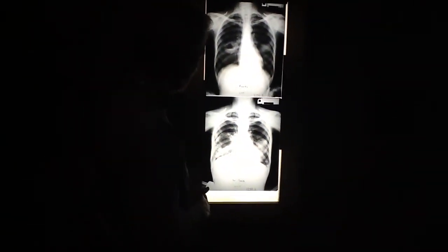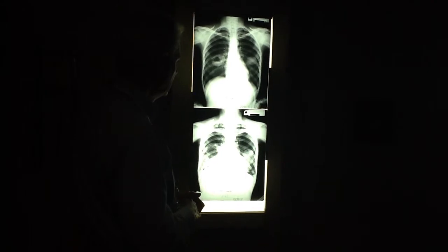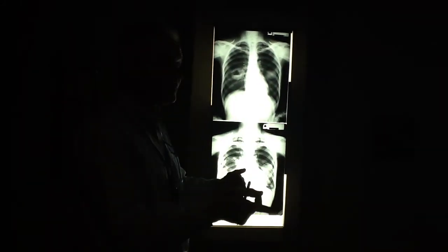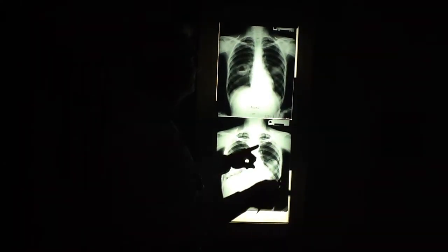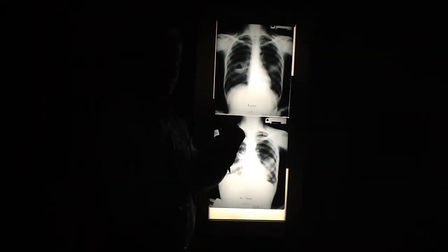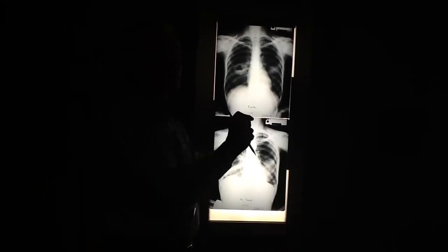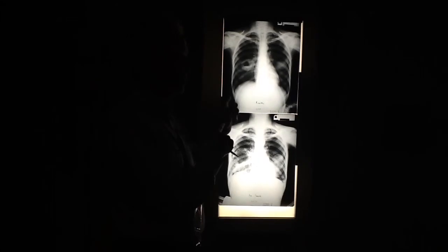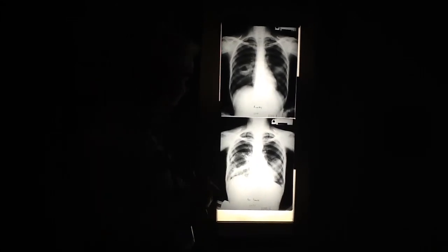This is a female patient, and she had cervical cancer, which is squamous. And squamous metastatic to the lung also commonly cavitates like a squamous primary in the lung does. Squamous is the most likely tumor, mets or primary, to cavitate in the lung. And our last one.